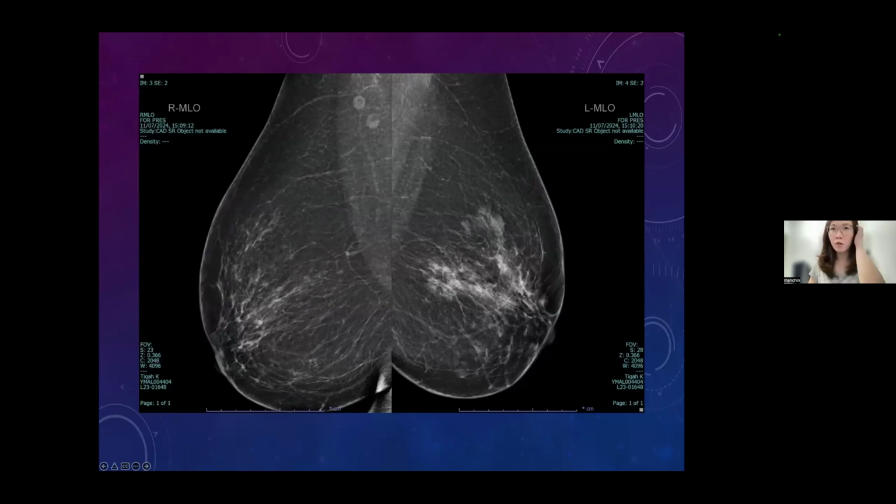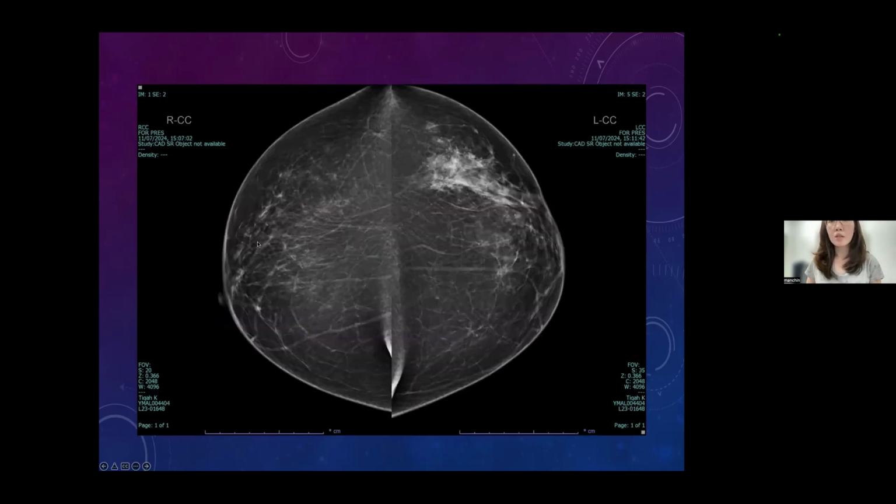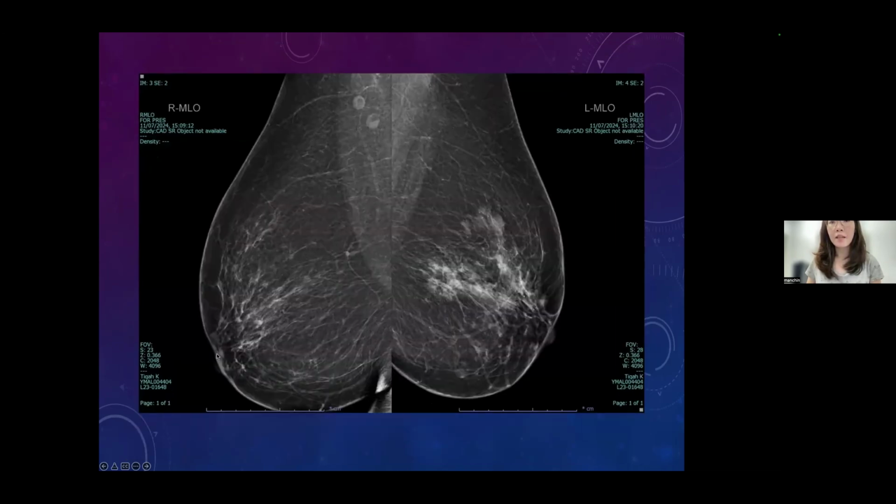So next, this easy one, mammogram, MLO view. So where is the abnormality? Just tell me the position of the abnormality, location. Left. Dense calcification? No, there's no calcification. Benign calcification, this one. So on mammogram, remember the position. This is an MLO view. So we draw a line from the nipple going up to the pec major here. This part will be upper half and the area below the line will be lower half. So this abnormality will be in the left upper or mid region here.